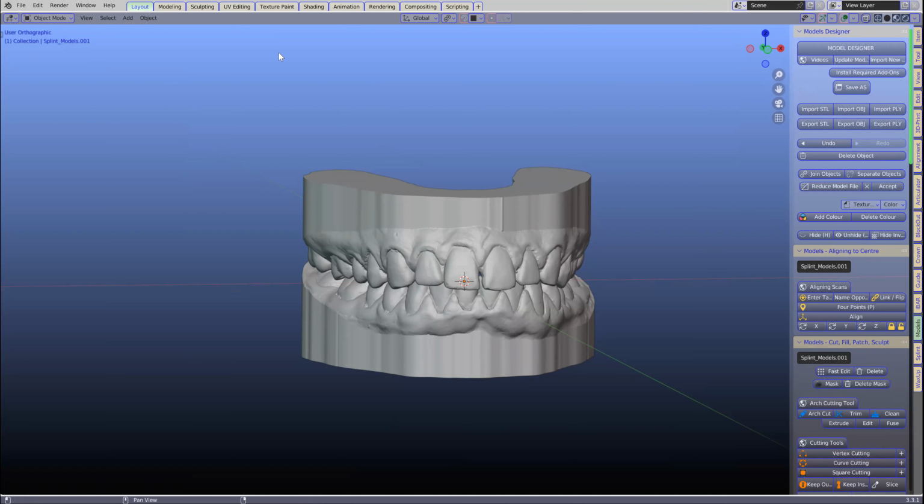Perfect. All right. So we've got two models. Are you able to make models yet, or do you have to go through that, or not really? Yeah, no, I can import models. That part we're good. Okay. So basically, what we need to do is articulate it.